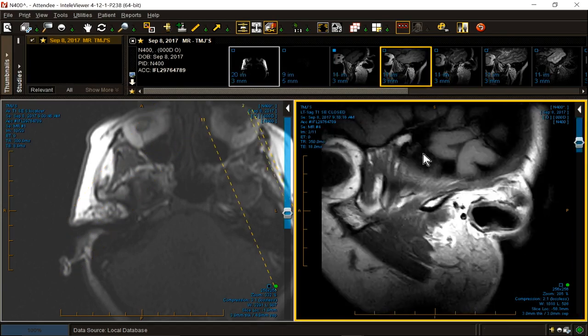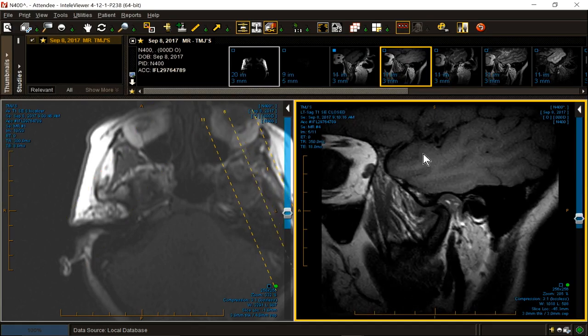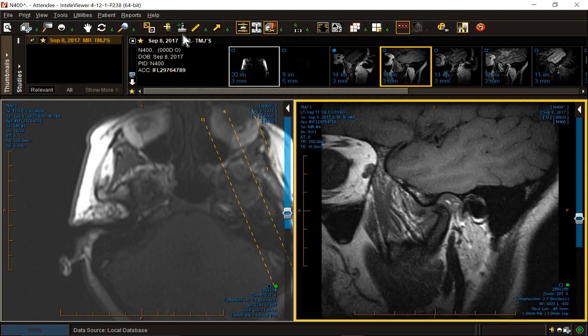Okay, let's pick another sagittal. Left side. That should be better, right? Wrong. It's also closed mouth, but why isn't the condyle seated in the condylar fossa, where the bilaminar vascular zone is, where the attachments are? Because this condyle, too, is a little anteverted and flat on top. It doesn't fit. Because it's riding hard with friction against the articular eminence, the eminence is sclerotic.